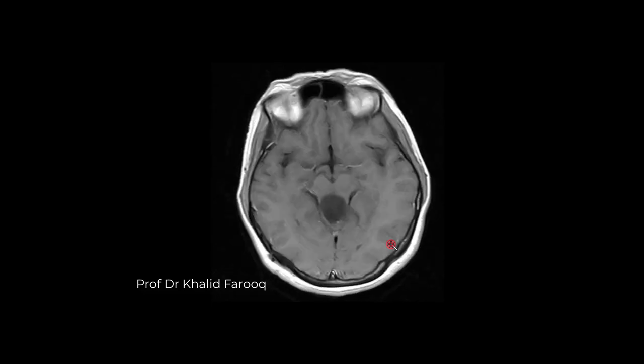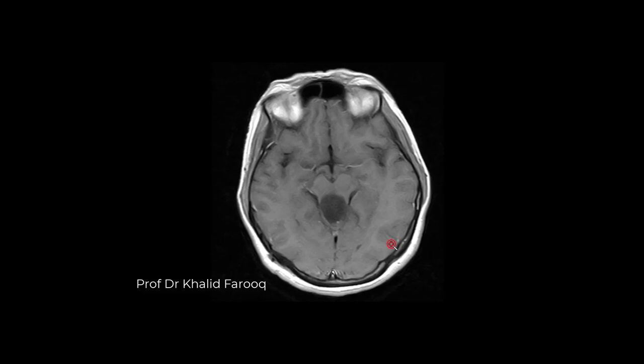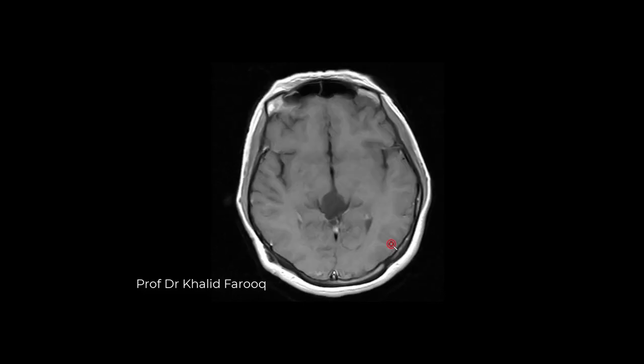So this is a rare case of cystic mass within cerebral aqueduct extending into upper half of the fourth ventricle, having differential between aqueductal cyst versus neuroepithelial cyst or ependymal cyst of the upper portion of the fourth ventricle, while differential of pineal body cyst can be given.